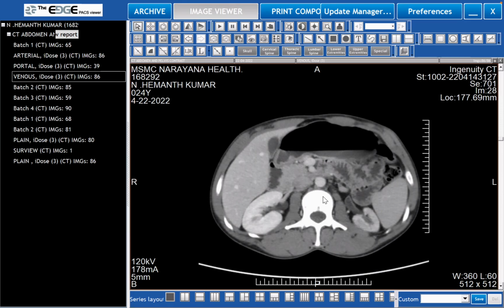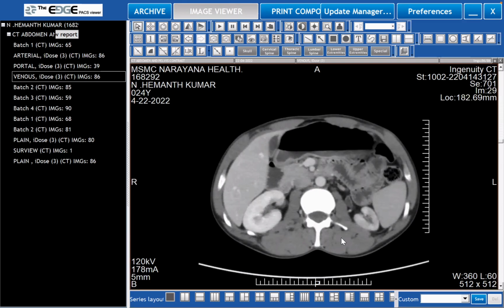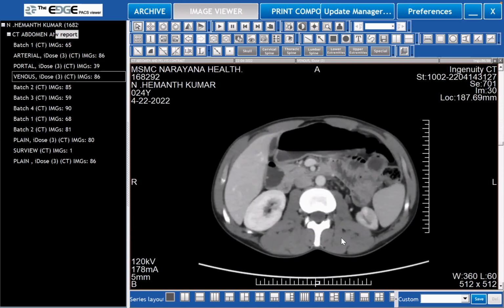Compare this to that. What is that white line around the pelvis? Is there thickening of the pelvis? Yes, sir. These are factors, these are points that will help you try to arrive at a diagnosis in such a patient.